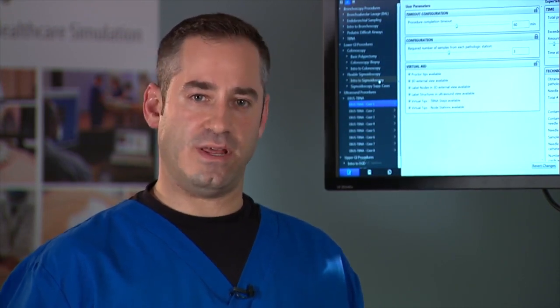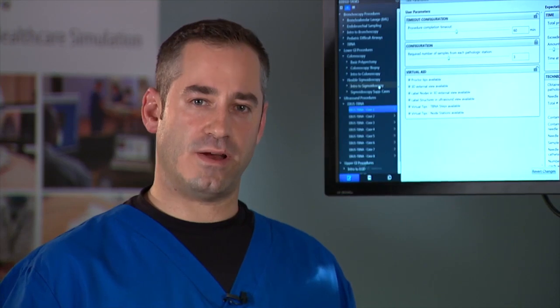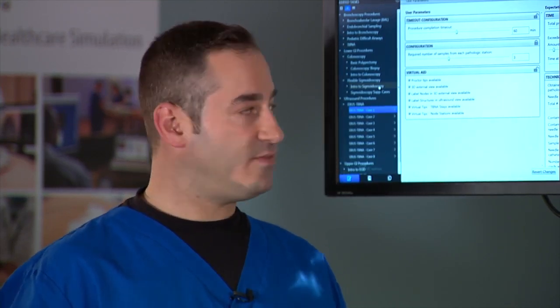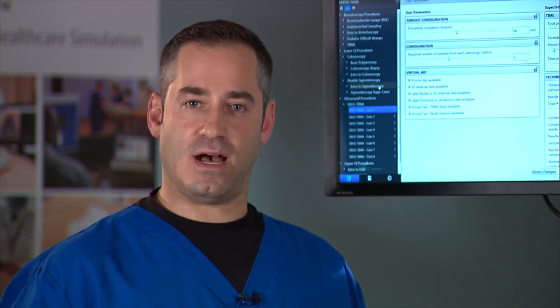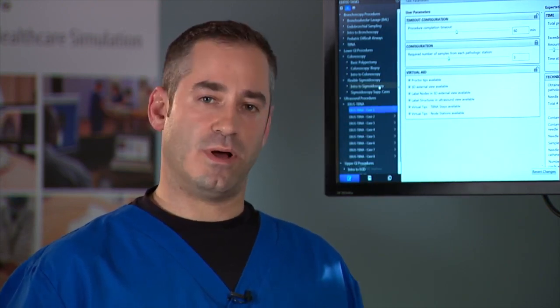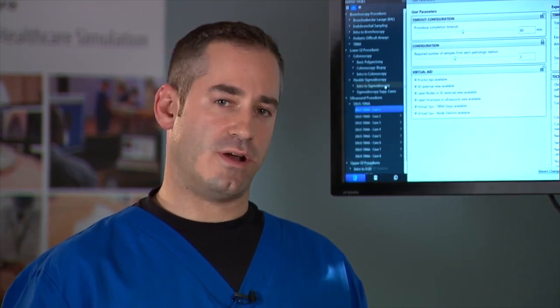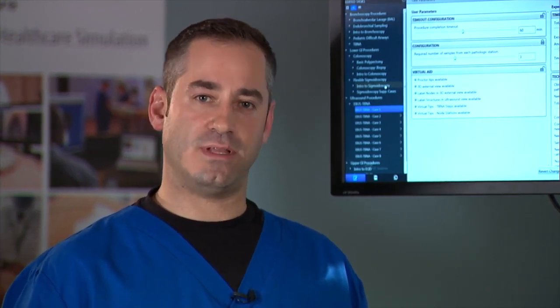Some of these are very unique to the EndoVR system and should be pointed out to your prospective clients as they will be of tremendous interest. Some of these features include the ability to upload didactic videos or multimedia content, create users in groups, and create curriculum, whether in an optional sequence or a mandatory linear sequence.